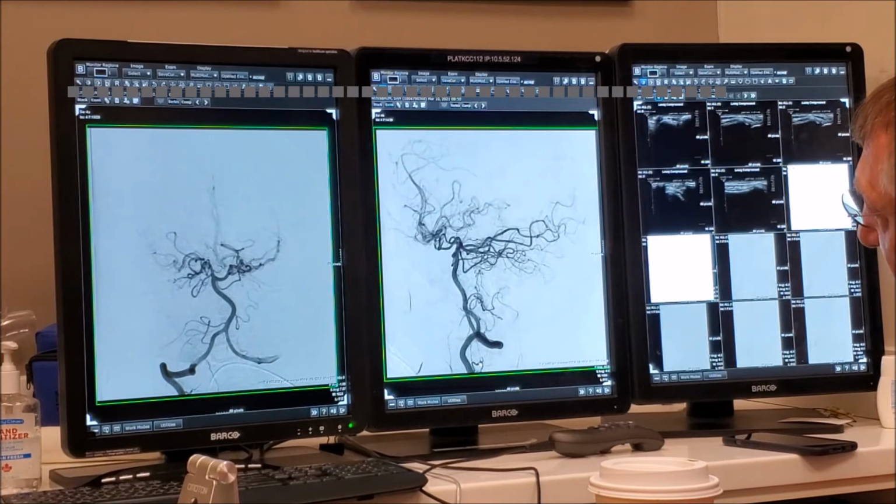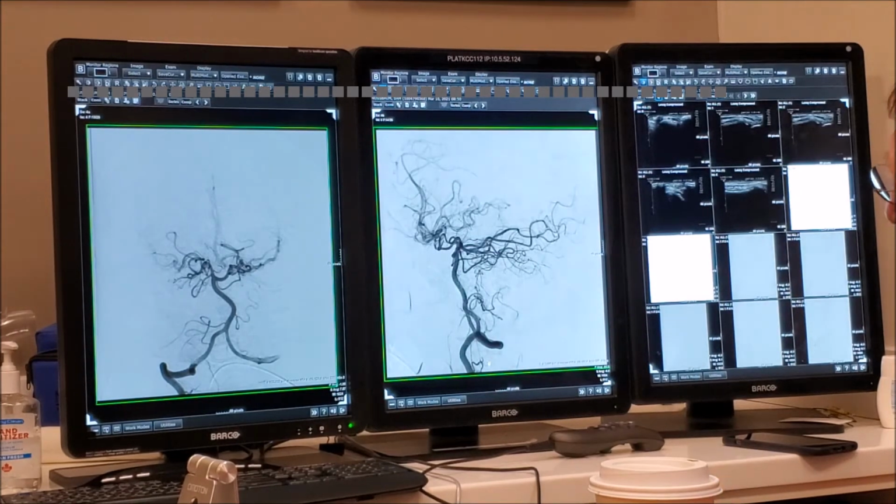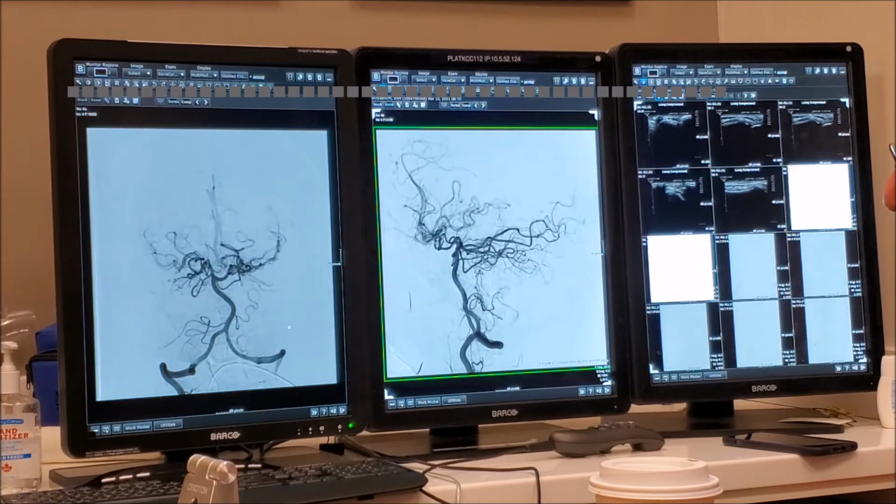In addition, C2 and C3 will anastomose with the cervical arteries. And C3 will anastomose with the ascending pharyngeal. Sorry, okay, that's not the case. But you see, there's a lot of information that's good to use. It helps you. Then we come up here and we see interesting stuff, right? There is this vessel going like this, and there is this one going like that. This is just to show you the symmetry in the vascular system is not correct. We're not symmetric.